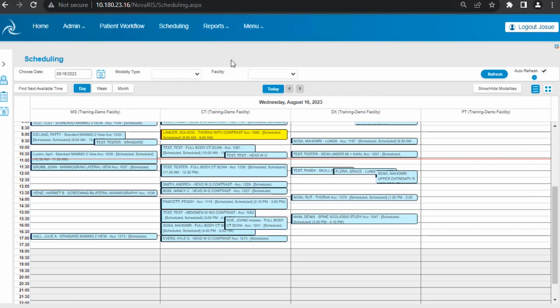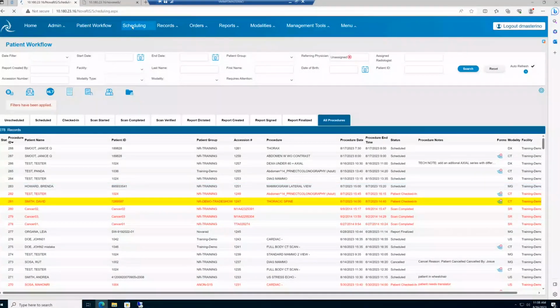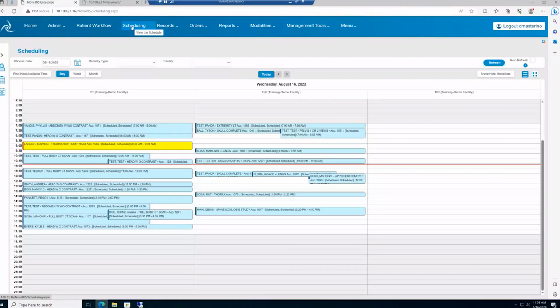So now I'm going to give back the time to Dina so she can start explaining to you about the scheduling page. Okay. Well, I'm going to start off with an overview of the scheduling page. Just general navigation. Anyone who's using the RIS is going to be familiar with these particular parts, but there may be something that you haven't tried out yet. So again, we'll try and give you something to think about to see if you want to make a change.